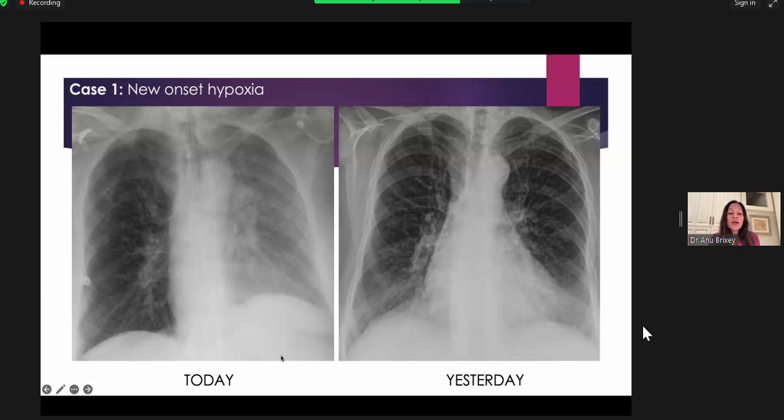Now, here's the first thing I do on most x-rays: I compare one side to the other to look for symmetry or asymmetry. The first thing I would notice on this x-ray is that there is marked asymmetry between my two lungs, for two reasons. The first is that there's increased attenuation throughout the lungs on the left side compared to the right. You can see that the right lung is much darker than the left lung. So clearly one side or the other is abnormal.